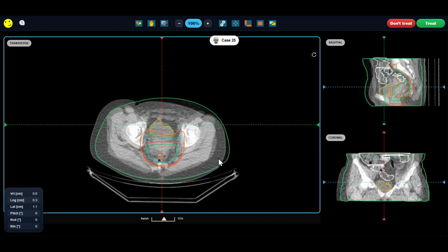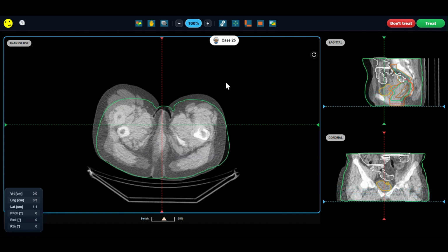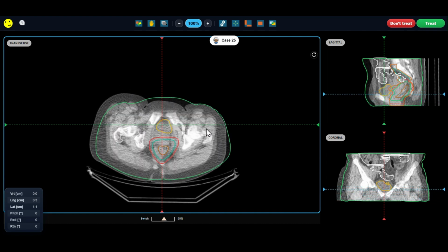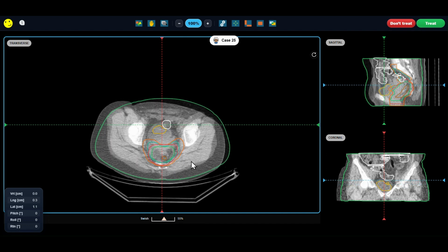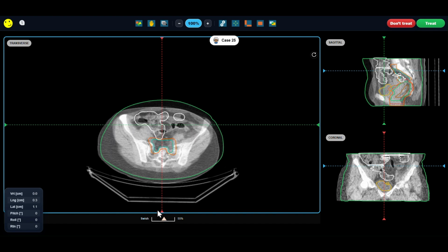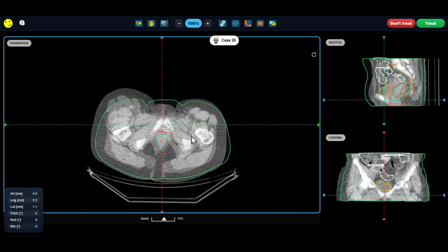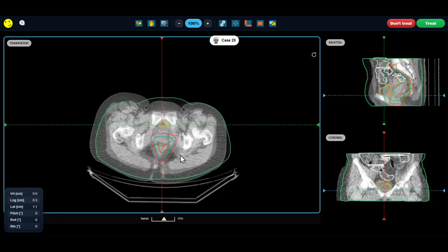And what I'm going to do first is to scroll through all the images just to double check and just to have a clear understanding of what's going on. Right, so I'm just going to scroll through. And just for anyone that's watching, can you guys visualize already what's happening? What are your thoughts right now? So I'm scrolling through this. Is there anything that you're currently seeing that is worth noticing?